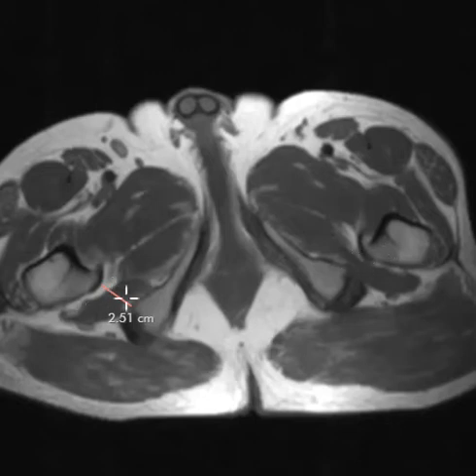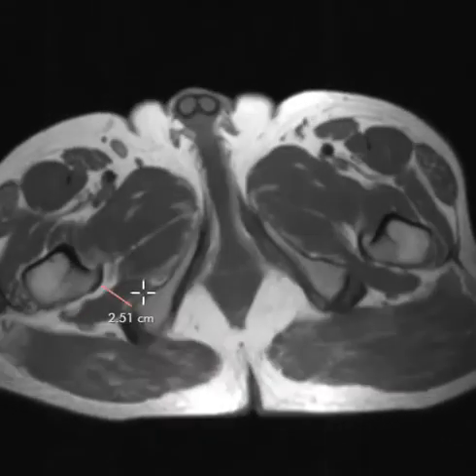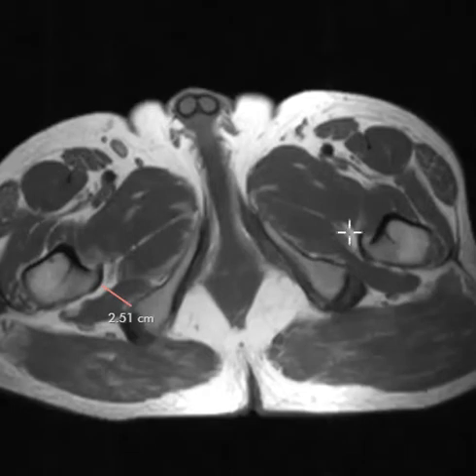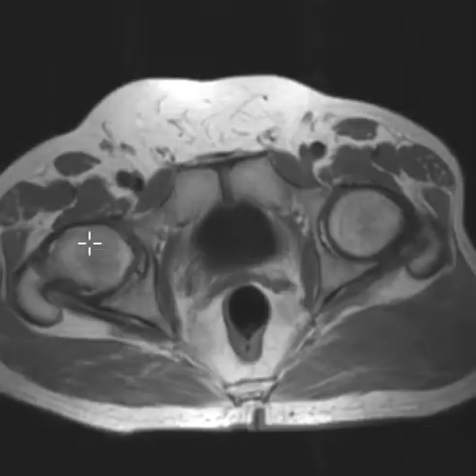On the right-hand side, you see you have a lot of distance here, so this muscle has lots of room to pass in between here. But again, this is incidental. The patient didn't complain of pain over here, but this can cause a left-sided buttock pain. But the patient did have one other finding that explained their symptoms, which is over here.